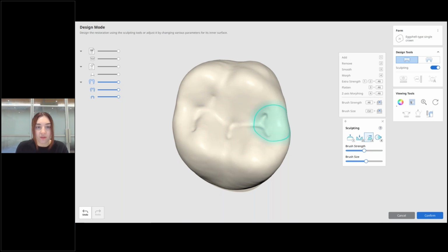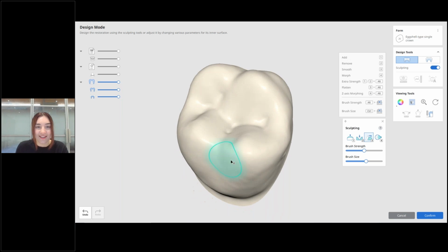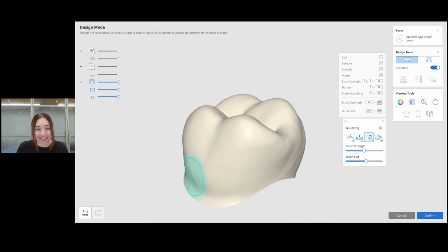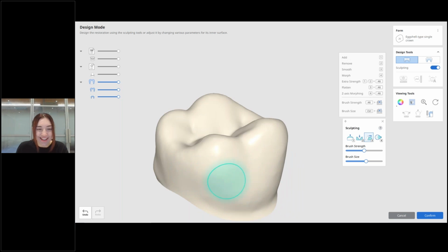Well, you're even getting secondary grooves in there. So, you know, your design skills are really coming along. Oh, okay, thank you.